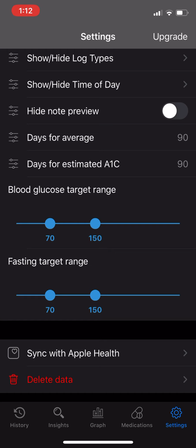For the onboarding process, there was nothing really special about it, and the screen that it takes you to after the onboarding process is not a very visually appealing screen, so I'm going to give that a 1.